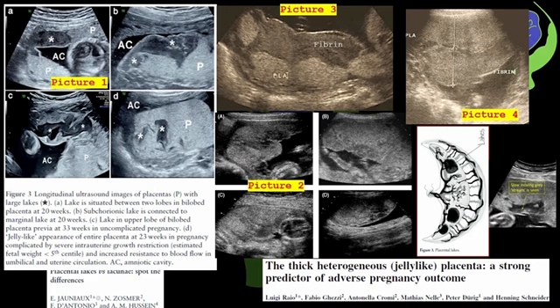These are often associated with intervillous fibrin deposition, and flow inside them is typically sluggish or of very low velocity. Such large or clustered subchorionic lakes are not benign until proved otherwise. They have been linked to microinfarction of the basal plate, diffuse intervillous fibrin deposition, and secondary lesions of placental malperfusion. Hence, it is better if we follow the maternal Doppler and rule out fetal growth restriction, and also have these patients under serial follow-up.